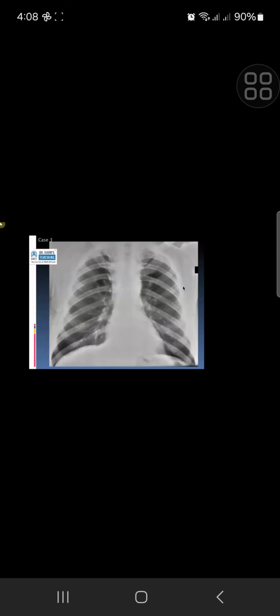I am presented with a plain X-ray of a skeletally immature patient. From the first instant, I can see that there is a mild degree of prominence of the right paratracheal region. I cannot see that the trachea itself is shifted from the mediastinal. Yes, this area that you pointed, doctor, and the one slightly upper to it. We'll stop you there. Is this what you refer to?